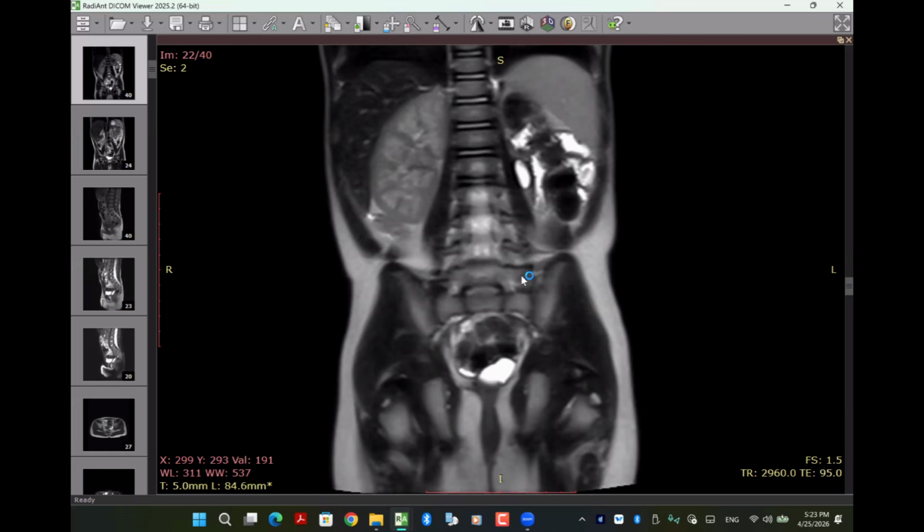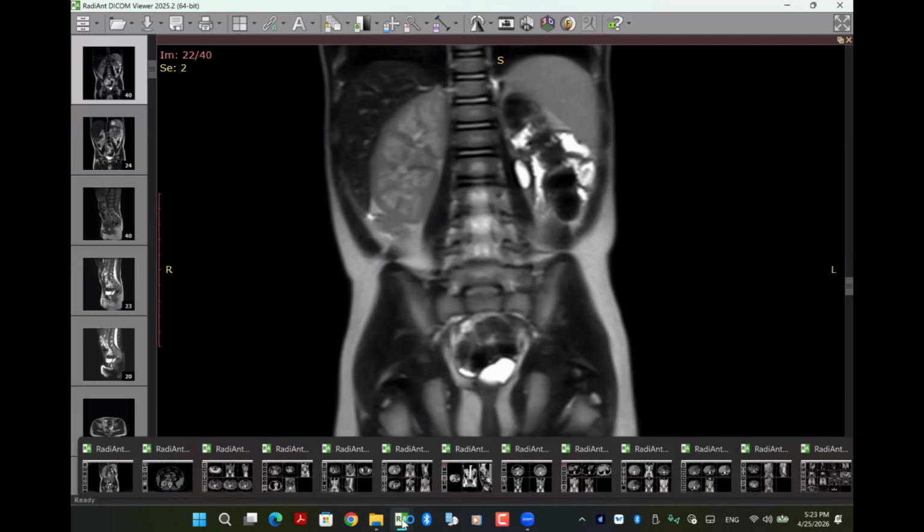He came actually because prenatally they found only one kidney and a cystic lesion. Then later on, they followed him up for this cystic lesion, and finally they did this MRI for him. Thank you for your participation, and you did very well in the first case of this para-aortic lymph node. Can we shift to the next candidate, please?